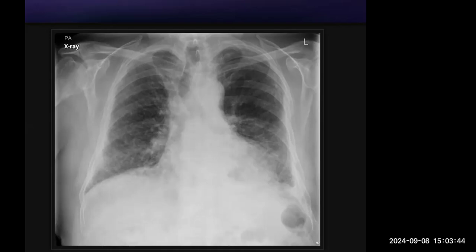The trachea appears deviated to the right side. I think that there's a fibrotic band extending into the right upper zone, causing this appearance. Apart from that, the bilateral hila appear a bit bulky, but again, respiratory volume is low, so that could be artifactual. The left CP angle is blunted. I suspect that there might be some pleural effusion or pleural thickening here.